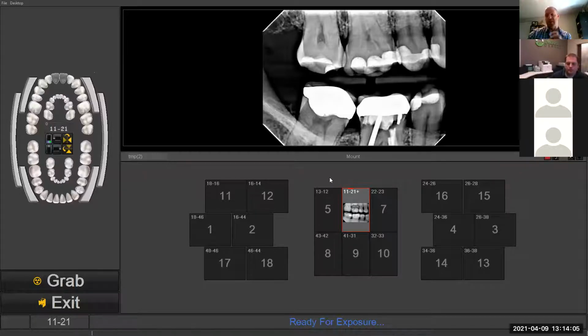So yeah, you can really set it up so that when you're taking x-rays, you can either follow the sequence, or you can choose a specific tooth. And then I'll show you after, once we get out, how you now have this historical viewing ability. So go ahead, you had a question, sorry? I think you'll probably get to it on that.